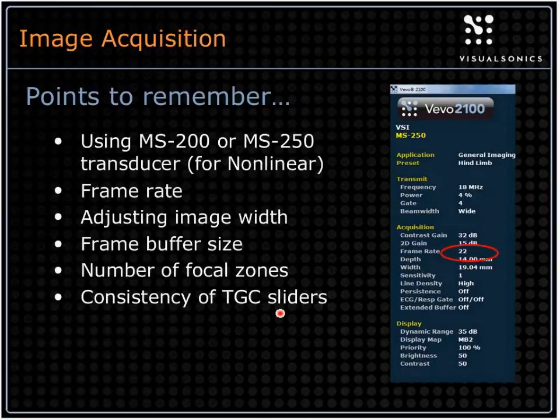There's a couple of different ways of doing that. One is to just set the sliders to the little catch in the middle. If you slide those sliders back and forth in their grooves, there's a little catch in the middle where they'll sit. So if you set them all in the middle, that's a nice home position. The other one is if you go to the Image Process tab on the system, there's a selection there where you can save the TGC settings.